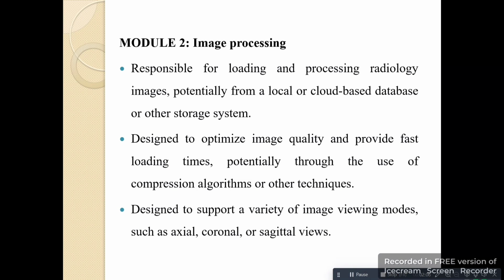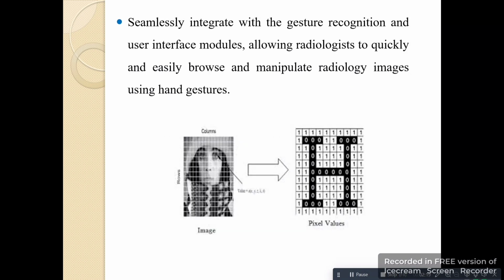Designed to support a variety of image viewing modes such as axial, coronal, or sagittal view. Seamlessly integrates with the gesture recognition and the user interface module, allowing radiologists to quickly and easily browse and manipulate radiology images using hand gestures.